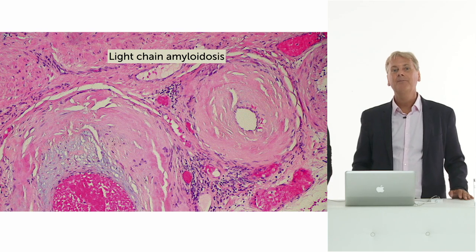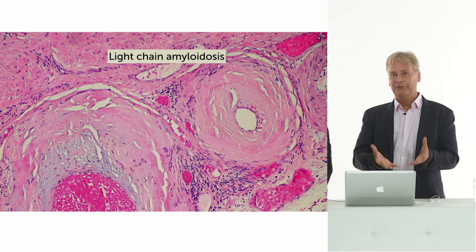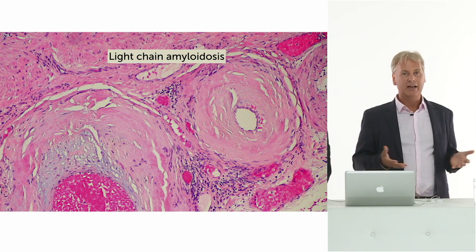I want to conclude this case here before we come to the questions, because I think this is very interesting. What do you think this patient really had? Well, amyloidosis. He had amyloidosis. Now, many of you are going to say, well, this is not a classic case of amyloidosis. You would have a speckled appearance, and maybe thicker myocardium and thickened valves. But there's a clear reason why. This is still an amyloidosis.